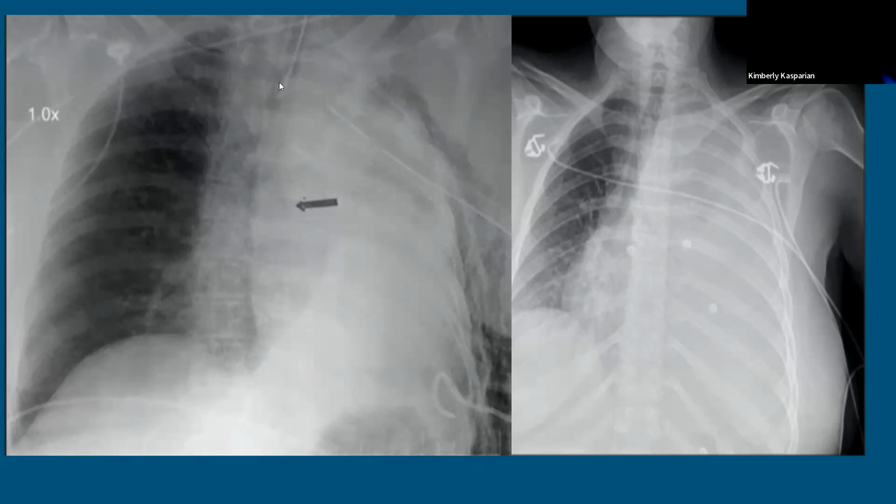And they have an intubated patient, so it's much more common in the ICU that you see the mucus plug side of things. But if you look really closely, right here and here, see how these ribs are only about a centimeter apart in this picture, whereas over here, it's probably twice as large. That's just because when you have atelectasis, the rib spaces will collapse a little bit. That's another way to tell.